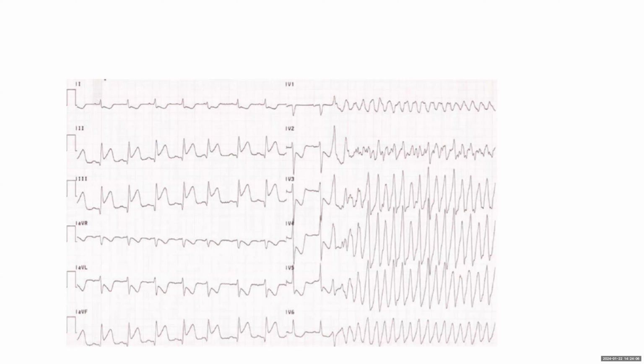PVC. I think if you code VT, I'm not sure if they're going to be okay with coding PVC and VT, because VT is essentially multiple PVCs. So if you have other obvious codes, I'd probably avoid that, the one just at the beginning. Yeah, but there's always a PVC at the first beat of VT. I know what you mean, but I don't know from an exam point of view if they're going to be okay with it.